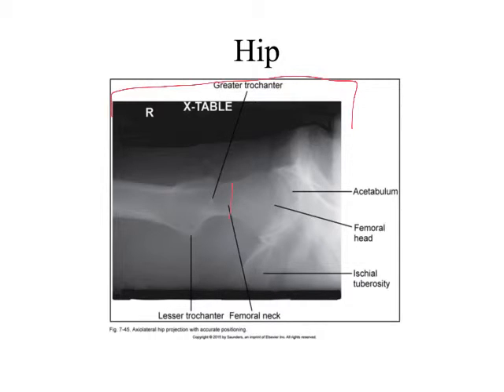As I look at this picture, this is now different from the last two images that we looked at, and we can see a clear difference between this image and the last one, right? This image is less bright, right? That's how I would describe this image. It is less bright because the technologist set a technique that was sufficient for the femur. Is everyone tracking with me on that?